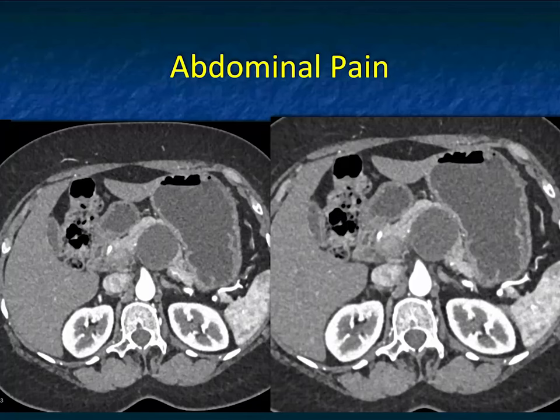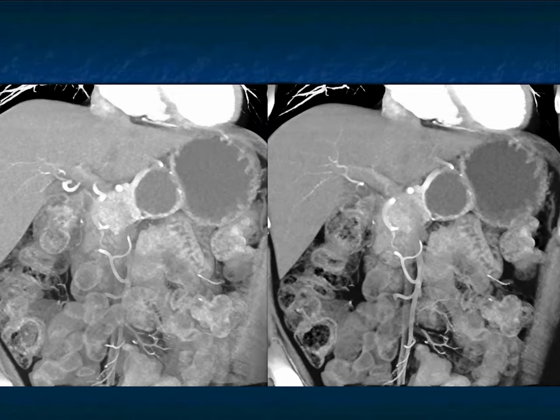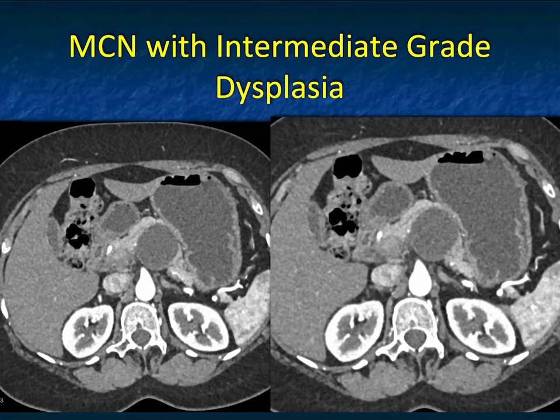Another example here, the body lesion, same size as the prior case, but again, calcification, but no septations, no nodularity. Think about the last case, think about this case. Here it's sharp margins. I'm much more comfortable that's low-grade dysplasia, but it ended up being an intermediate-grade dysplasia.